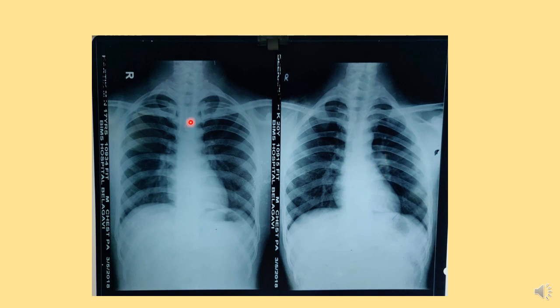Look at the clavicle. This is right and left clavicle, and we may ask you to count the ribs in examination. So you should really observe very carefully to look at the first rib. You can see this is the outline of the first rib. On the left side, this is the outline of the first rib. This is the outline of the second rib. This is the outline of the third rib, like that.